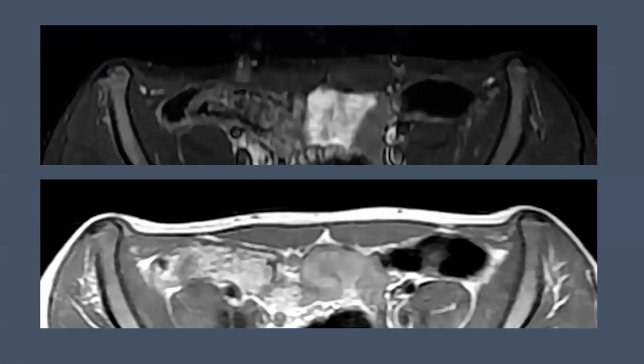After a few days, probably the patient didn't have much relief of pain, for which subsequently they performed an MRI just to rule out something that was missed on ultrasound. On MRI also, both the hip joints were perfectly normal as it was seen on ultrasound. And as you can see, this is at the level of the anterior superior iliac spines.